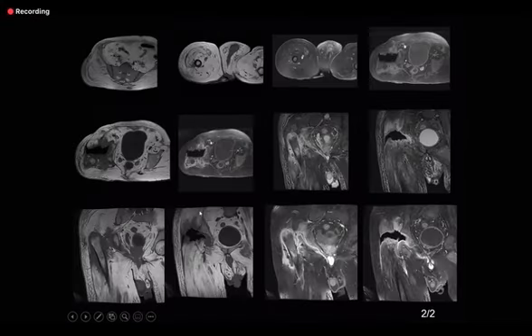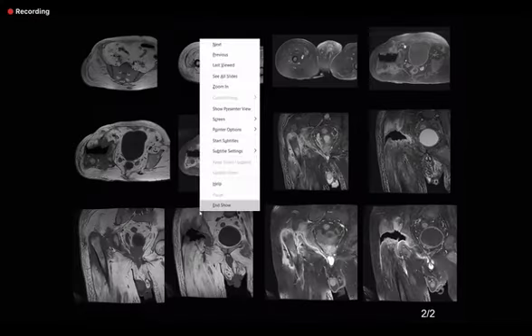So I will now show you a case in a sort of a PACS format, like yesterday. So, and I would like you, just one second, I think I have not shared it correctly.